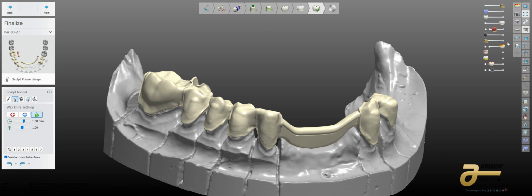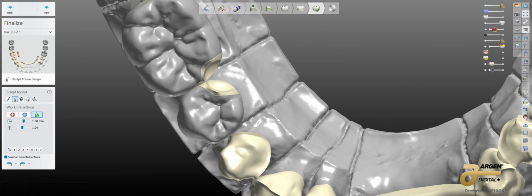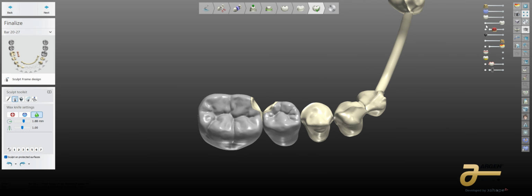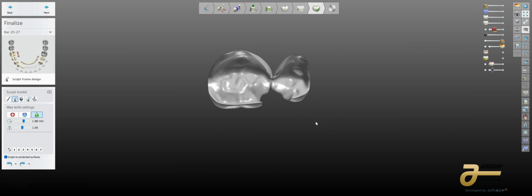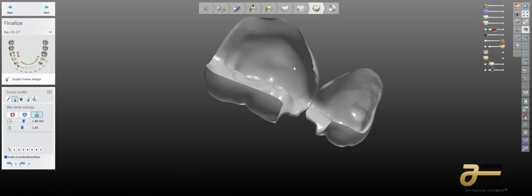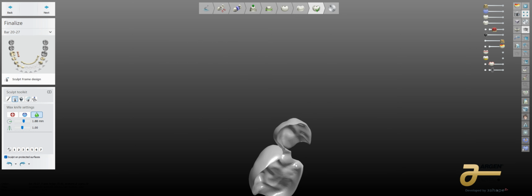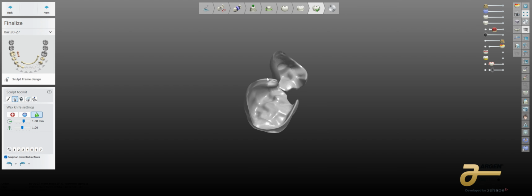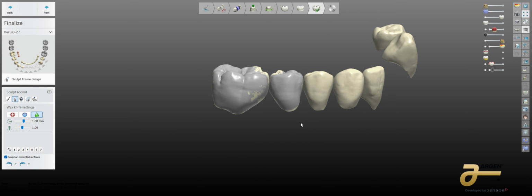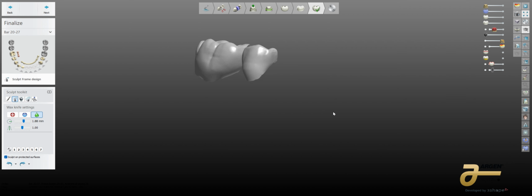All right. So having that additional scan come in, what does this do? What does this open us up to being able to do? Well, you know, if I had enough dimension on anything, I could essentially mill it, right? And if I had enough offset to anything, I could mill it, right? Well, you can see that because of that offset, the bridge is not eliminating the actual undercut to the metal, it's going to have a little bit of a belly and it's not going to draw as easily. And we're going to have super sharp edges. But what it does show is what is really possible in here, understanding how to manipulate the product. And that's really what I wanted to show today.